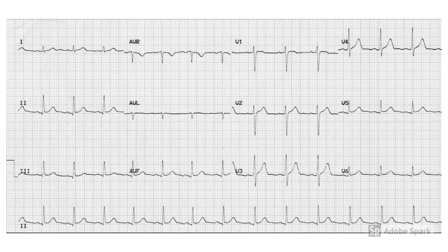So there's our ECG. Again, if we go through our rhythm, axis and morphology, looking at the rhythm to start with, it looks like it's sinus rhythm in that there's P waves to every QRS complex. If you calculate the rate, I think it's probably easier just to count the number of QRS complexes in the rhythm strip. That gives a rate of around 78 or so. Looking at the PR interval, that's normal, so that's in between 0.12 seconds and 0.2 seconds. There's a P wave to every QRS complex, giving a ratio of 1 to 1. And the QRS width is narrow, so it's less than 0.12 seconds.